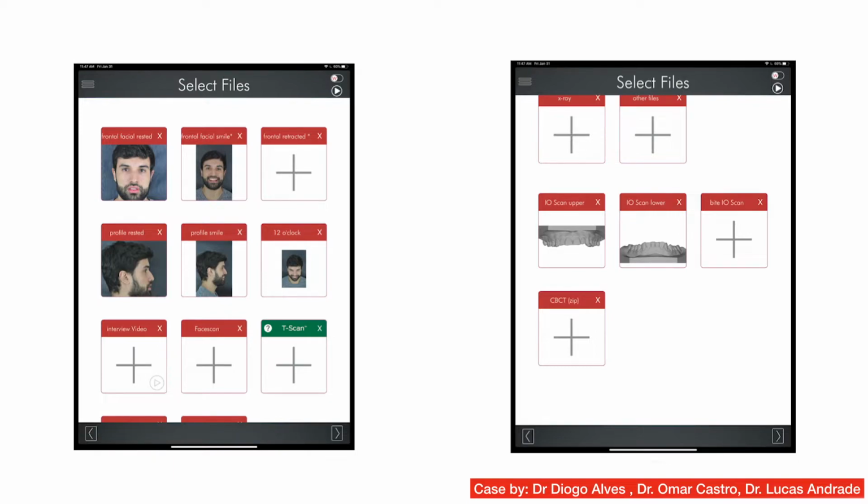The buccal cusp edges of the premolars were also slightly outwards, giving a disharmony in the buccal corridor. So our goal was to bring harmony to his smile by bringing the buccal edges slightly inwards, slightly increasing the length of his upper left teeth and slightly decreasing the length of his right upper teeth.